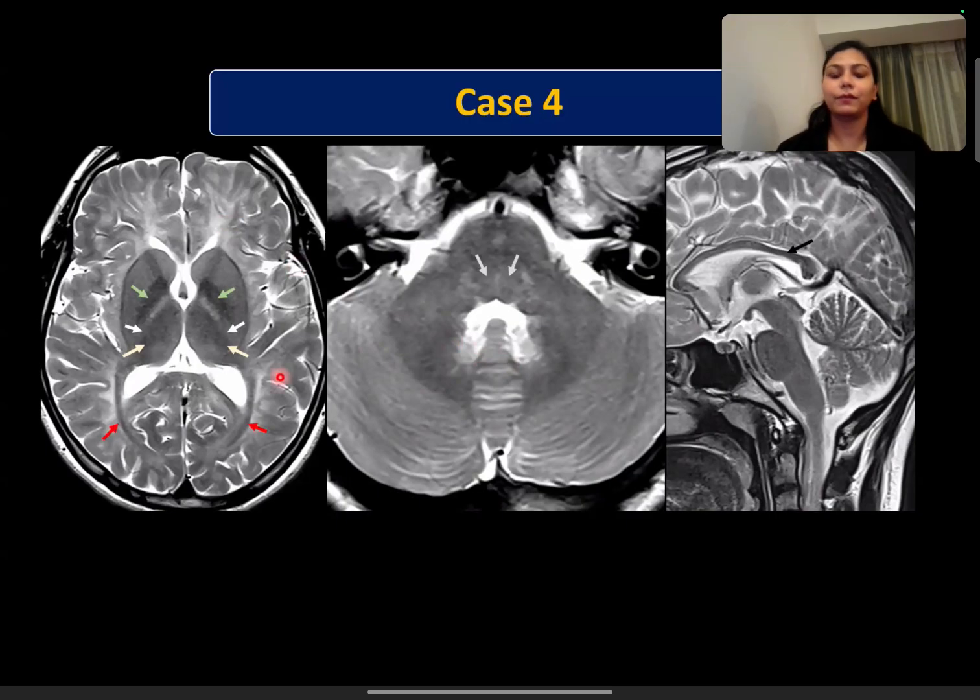If you don't remember anything in hypomyelinating leukodystrophies, remember Pelizaeus-Merzbacher disease, remember Pelizaeus-Merzbacher-like disease, and remember this disease, which can be a spot diagnosis and can be a little common as well when we are dealing with hypomyelinating leukodystrophies. So we are seeing diffuse hypomyelination. In addition, there is sparing of certain structures. What do you think this structure is?